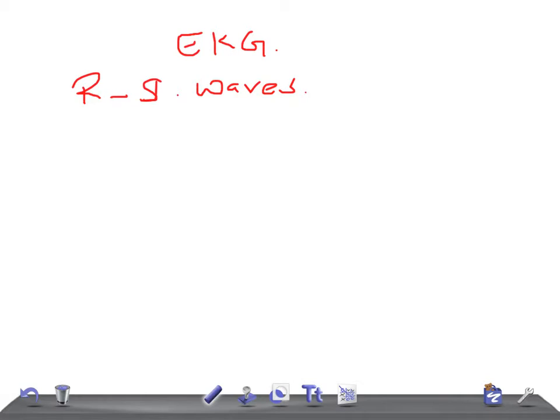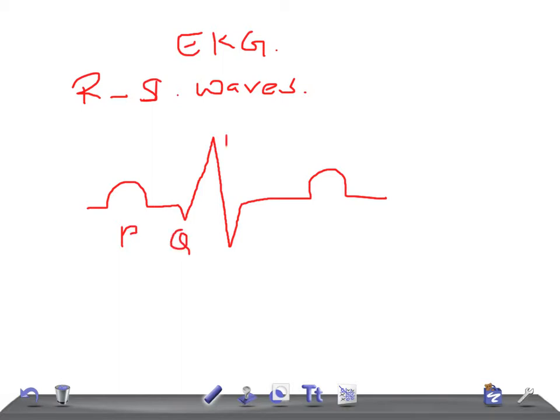Okay, so you know very well this is a P, Q, R, S, and T, right? So we're gonna talk about the two waves, that is this, right? Okay guys, excellent. Now R and S wave, we have different leads.